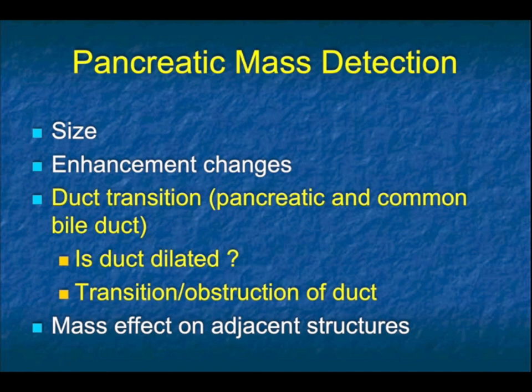a tumor present. Yes, I know a duct can be dilated and there could be a stricture from chronic pancreatitis. There are a number of potential reasons, potentially trauma. But in a patient where you see a cutoff of a duct, you have to look for a mass. Now, you're not always going to see a mass, but there's a mass likely to be present. We can see a duct cutoff with typically adenocarcinoma, but you can see it with neuroendocrine tumors. Some of the smaller neuroendocrine tumors which grow in the duct are serotonin positive, and that causes a desmoplastic reaction resulting in the duct dilatation. But most of the time, we're likely thinking about pancreatic cancer.